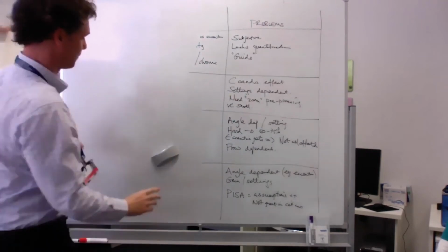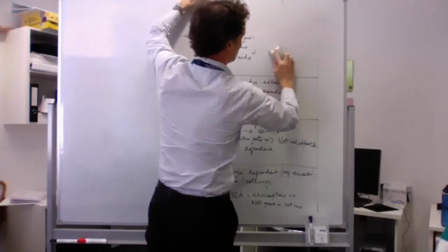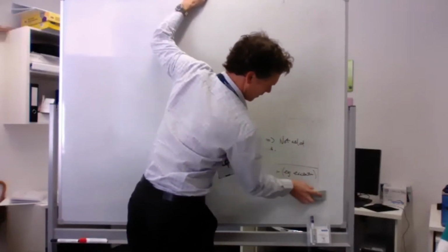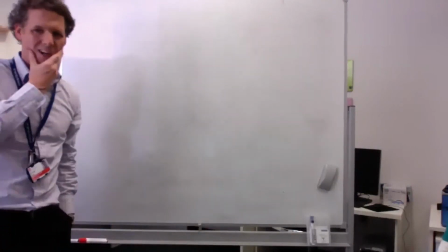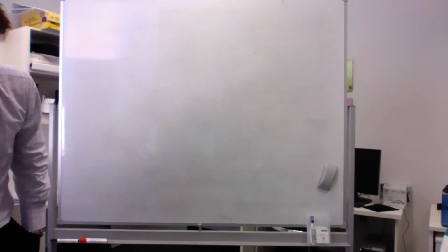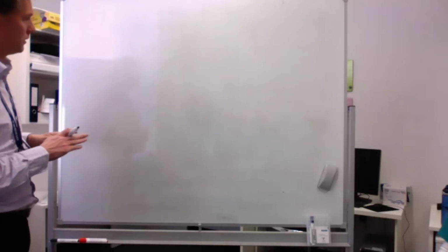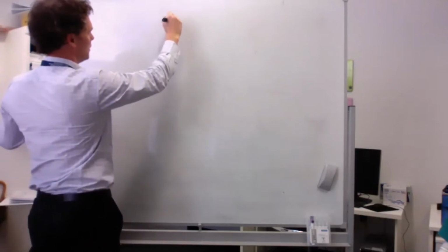So the specifications for defining prolapse are that the valve structures fall behind the level of the mitral annulus by at least 2 millimeters. Yeah, nice. I had 5. That's on a long axis view. I thought it was 5. This is 2. Excuse me. Sorry about that. I think 5 may be suggesting it's more severe. Fair enough. Yep. What causes it? And in fact, that's on parasternal long axis. I think the criteria are slightly different for the different fields. But strictly speaking, that's the definition.